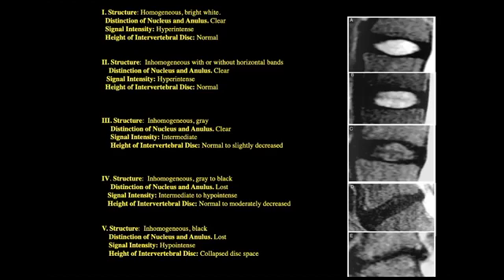You don't really have the instability phase or inflammatory changes that you get with degenerative disc disease. So it's really kind of the C and D categories, which I would consider an indeterminate disc, in terms of considering it a pain generator, that is a nociceptor.